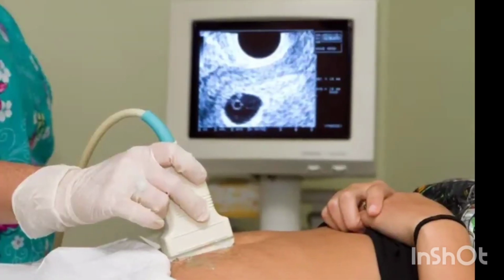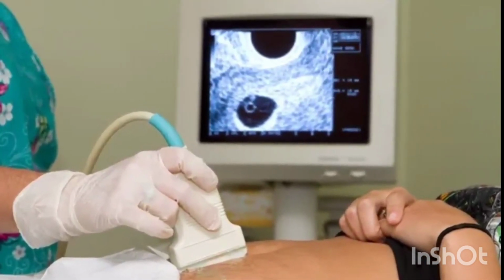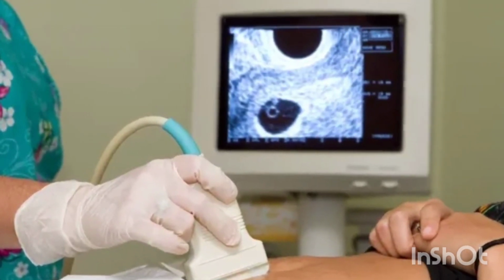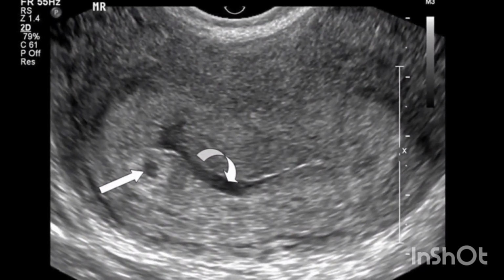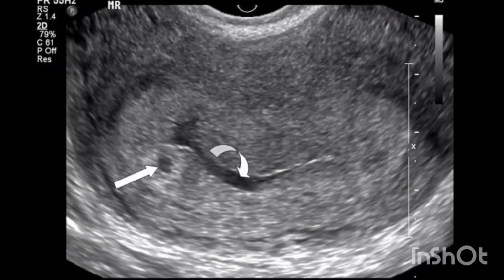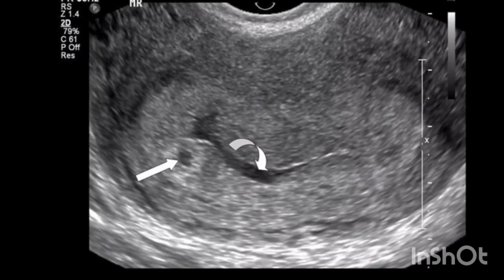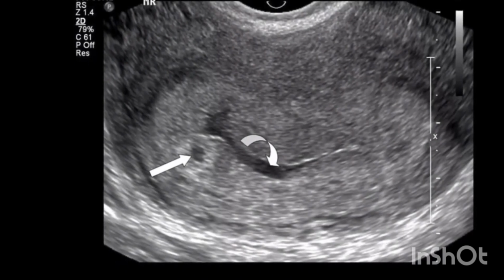The gestational sac is a fluid-filled structure surrounding an embryo during the first few weeks of embryonic development. It is the first structure seen in pregnancy by ultrasound as early as 4.5 to 5 weeks of gestational age and is 97.6% specific for the diagnosis of intrauterine pregnancy, meaning it is the only available structure that can be used to determine if an intrauterine pregnancy exists until the embryo can be identified.